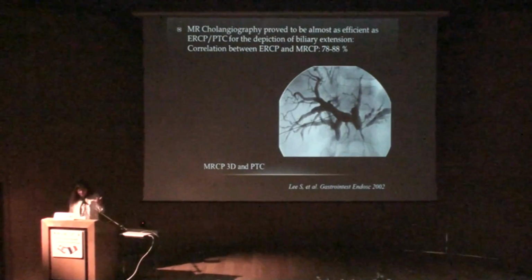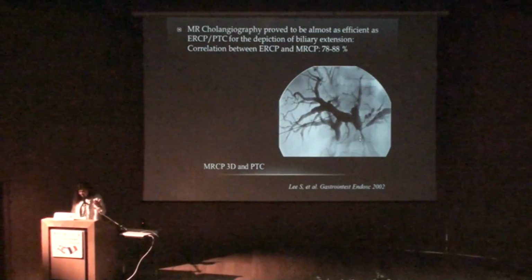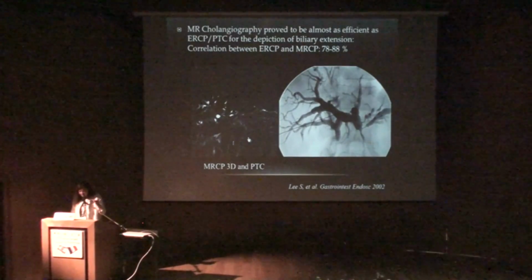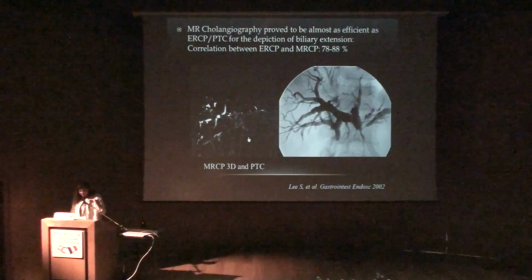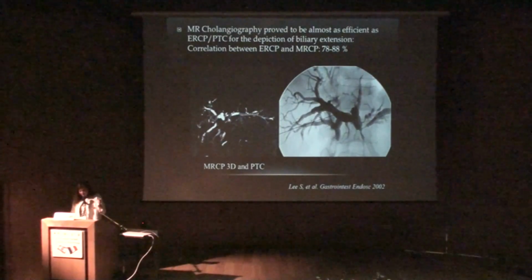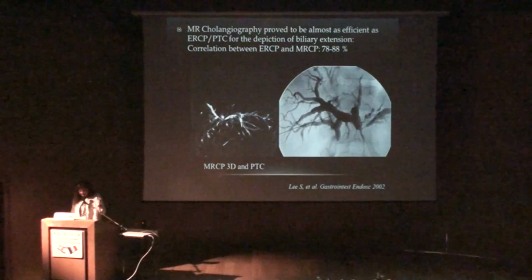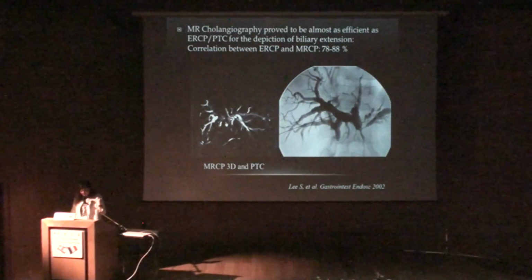So you have exactly the same image here on PTC and using 3D MRCP. Now it's working, so you see here very nicely the same structure.